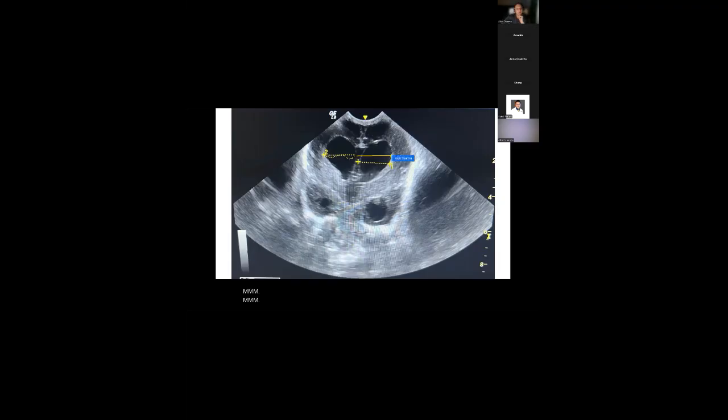Okay. So you really want to measure it to the lateral most margin as far as you possibly can, because the innermost margin over here will give you a slightly different value. This one is correct, absolutely no problems with it. You just want to make sure you're measuring it from the midline. So yeah, but well done.